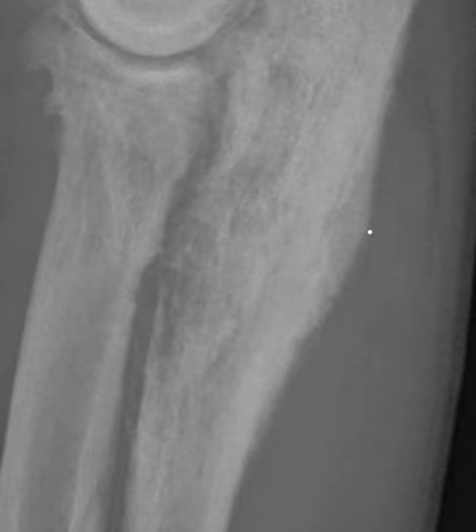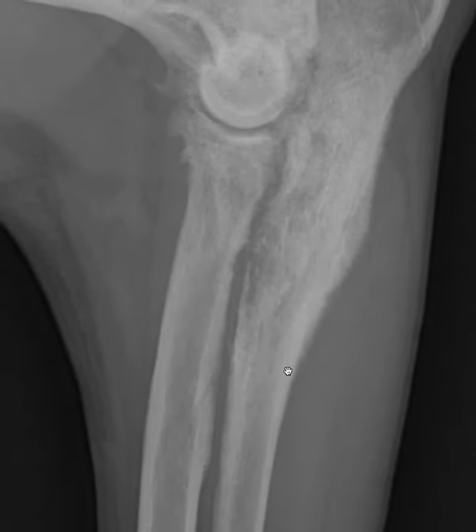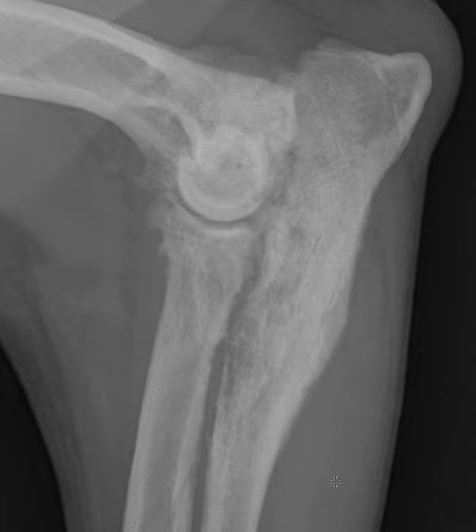So for me, this is actually a mildly irregular periosteal reaction on the lateral view. Now that I zoom out, you may also be able to appreciate, even from a distance, after having zoomed in, some of the areas where that periosteal reaction does look just a whiff more irregular than one that would be perfectly smooth. I'm going to go to the orthogonal view.